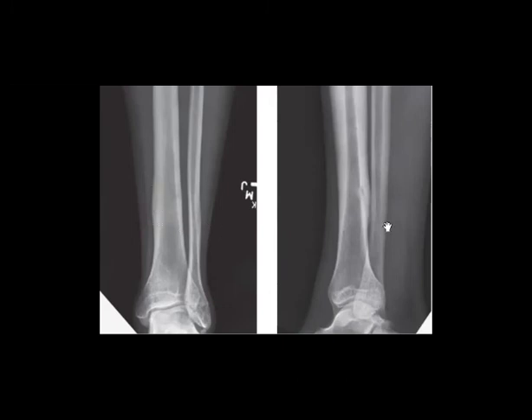And you can see like a lucency passing through the cortex. So you can imagine that it could be a stress fracture. Well, this is what is called a longitudinal tibial stress fracture. Nice, Nermeen. Marwa. So it is straight.